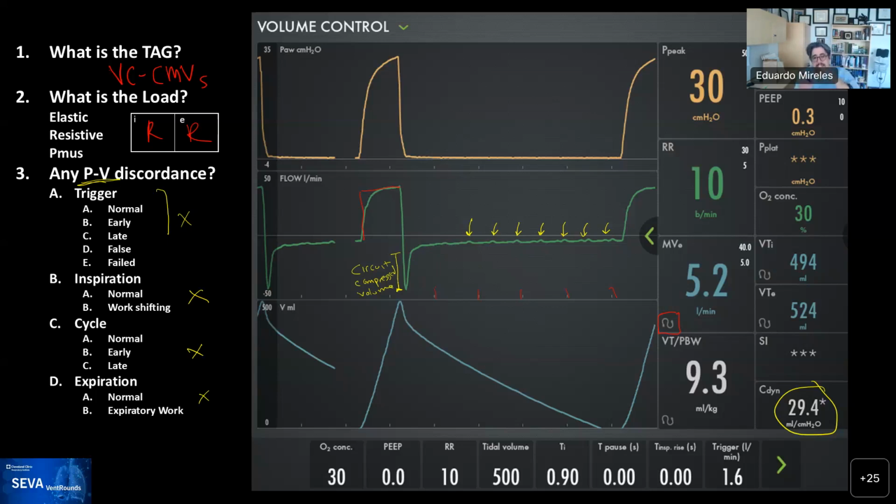Let me see what else is in the chat. Rob, any other comments? No, just that those perturbations are high frequency, about 2 per second, so it's not likely that it's going to be someone breathing. It's just a heart rate.